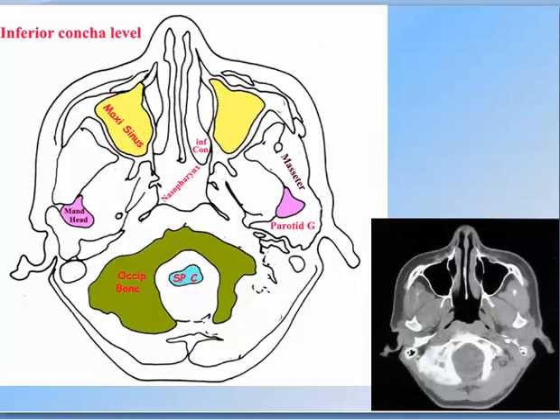We will start with some of the anatomical landmarks. So what is this one? It is the inferior concha. What is this? It is the maxillary sinus. This is the mandibular head. Inferior concha, maxillary sinus, mandibular head. Masseter muscle, parotid gland, spinal cord, occipital bone.